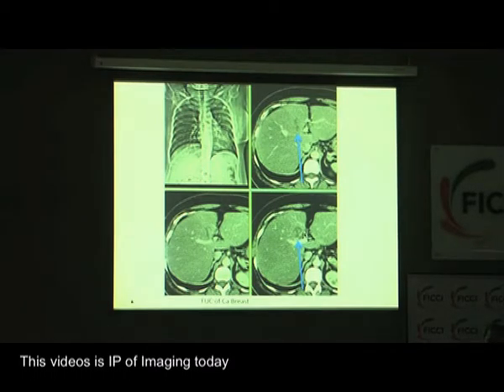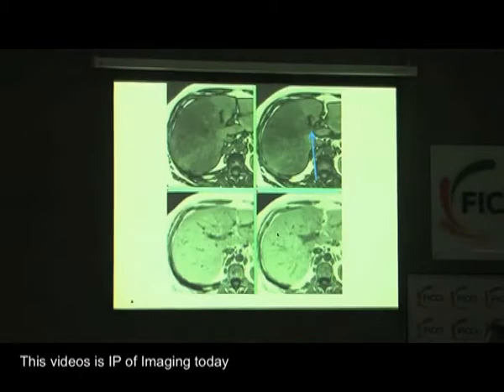Here's a patient with CA breast, who came for a CT and there was this lesion which was looking more rounded, and there was a high suspicion of metastasis. But being a common area of fatty infiltration, one did go ahead and do an MR in an opposed phase. We just put the patient into the magnet and just did this single sequence.